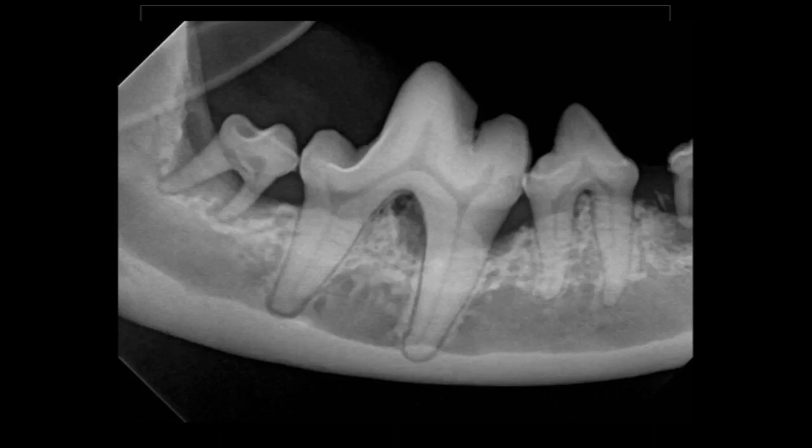You see that we've got bone loss in the furcation, and we've got bone loss extending to the bone between the fourth premolar and that first molar. So if you are presented with this next week, you have to take into consideration a couple of things.